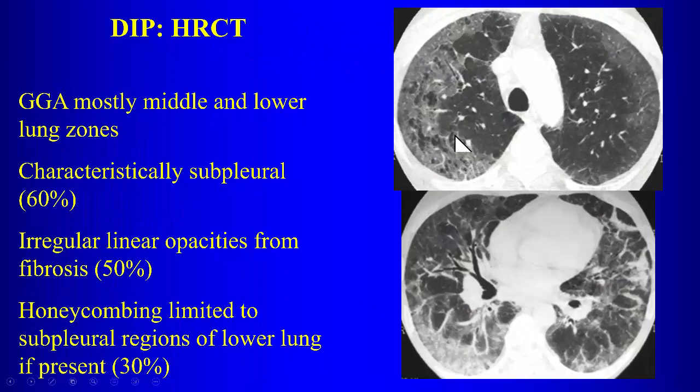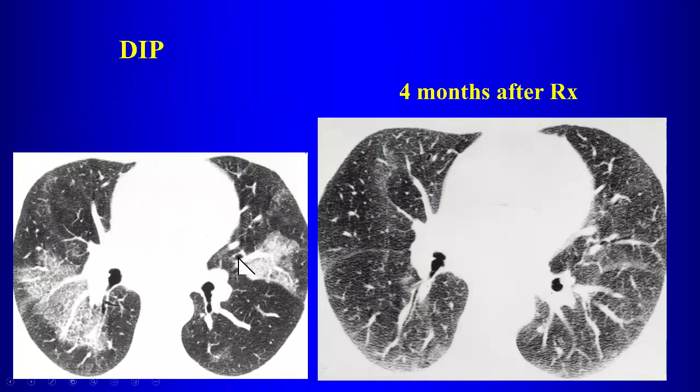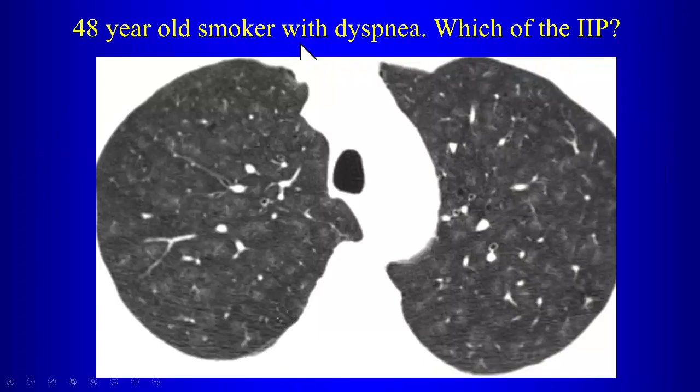So it's ground glass. It might be in the periphery. You might have these lobular regions of air trapping. Again, these patients are smokers, so they might have some underlying emphysema, small airway disease, with underlying air trapping. So that's what we see with DIP. We usually don't see honeycombing with DIP. And then it does respond to steroids and to smoking cessation, so it does get better.